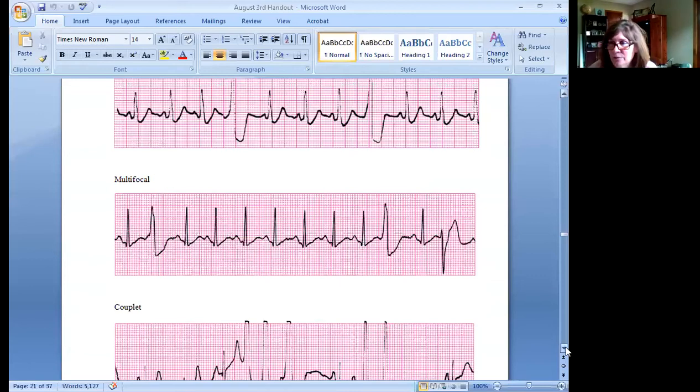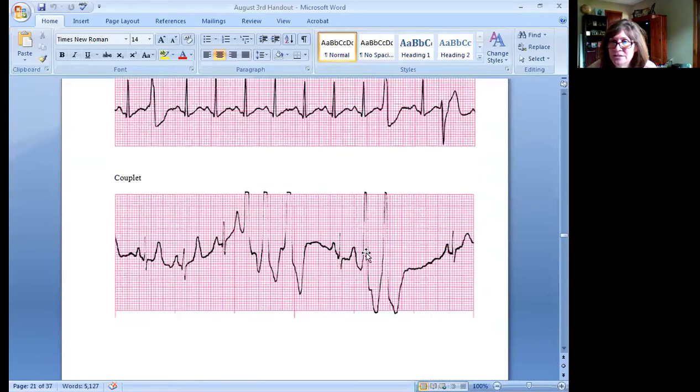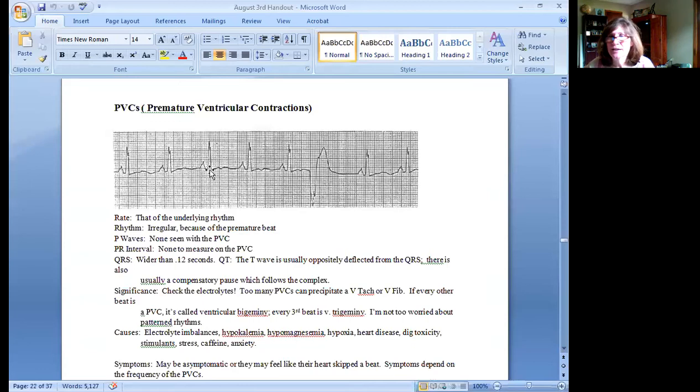Check this out. What is a ventricular couplet? Well, it's 2 PVCs in a row. What's 3 PVCs in a row? It's not a triplet. It's a 3-beat run of VTAC. What's his potassium? All right, so PVCs. Here is a 6-second strip. And you see the little notched QRS? It's a little bundle branch block. No big deal. I'm not going to test you on that.